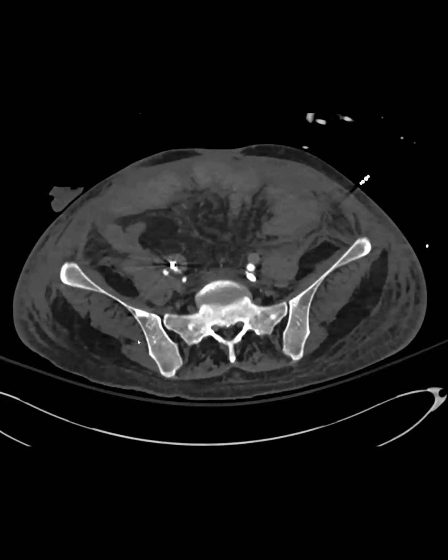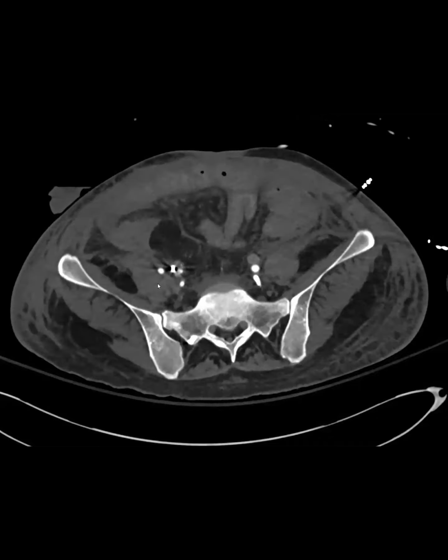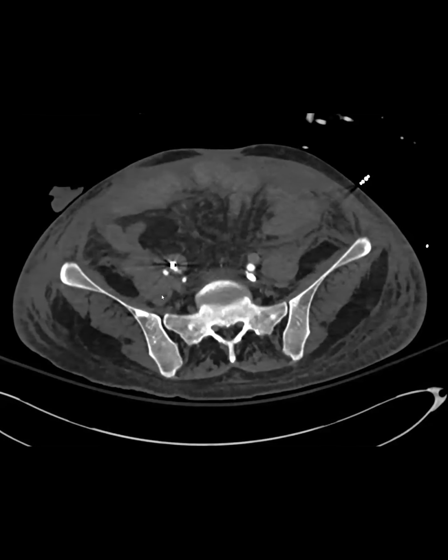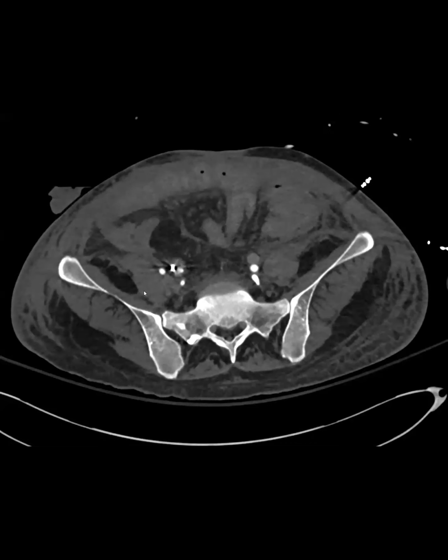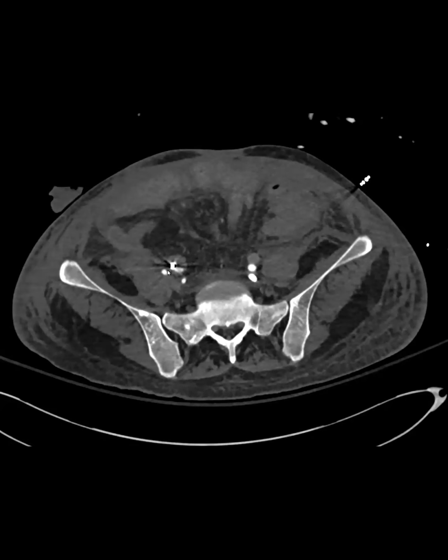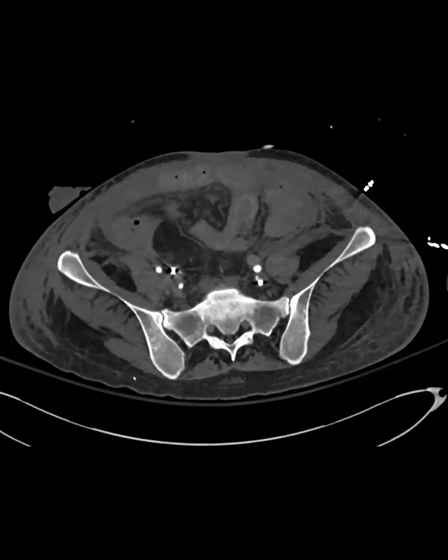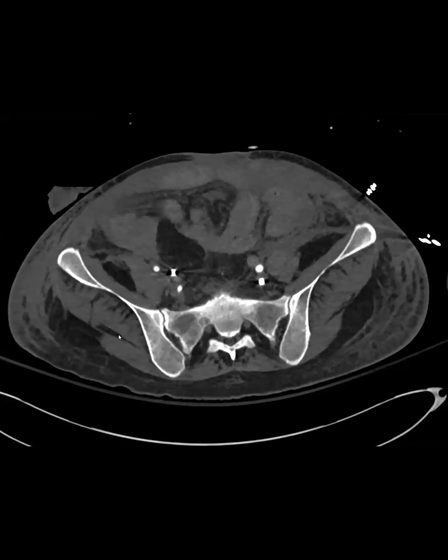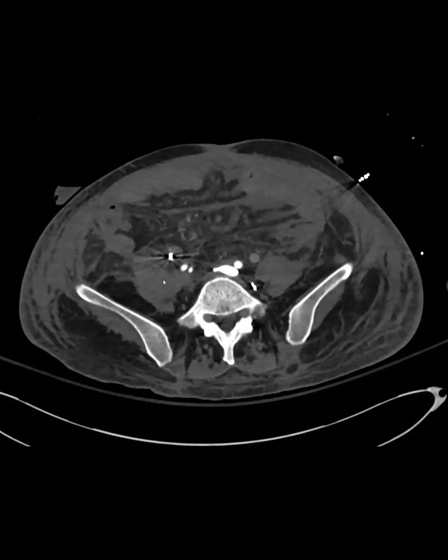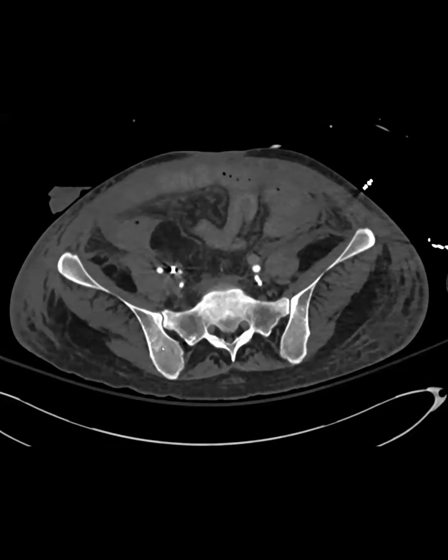So what would you call this? There's a fistula between the little vessel posterior and the ureter. Exactly. I didn't even know there was an acronym for this, but this is an AUF, arterio-ureteral fistula. This is rare, but not as rare as you would think. I'm going to show you a cool paper that I found, but first I'll explain my understanding of it.